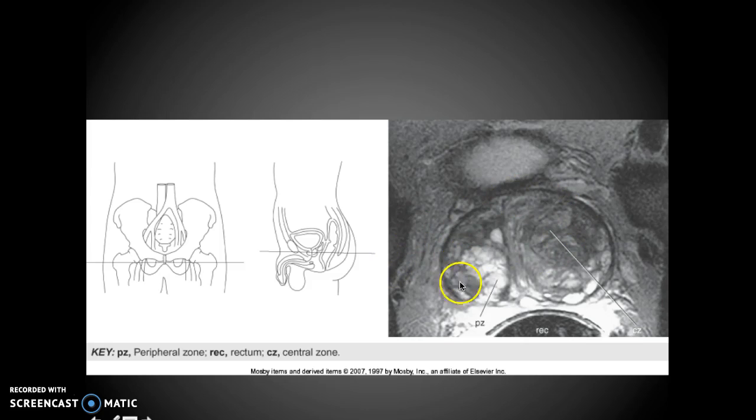So this is just an MRI. This has a rectal coil also. This is kind of old school. We don't use those anymore that I know of. Some places that are specialized for prostates do, but overall we don't use it. We can get high enough signal without them.